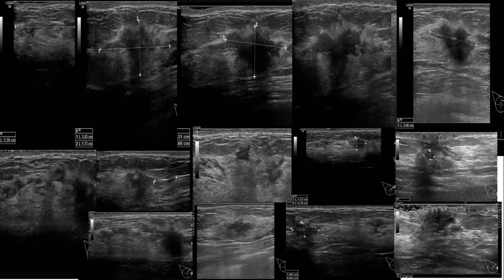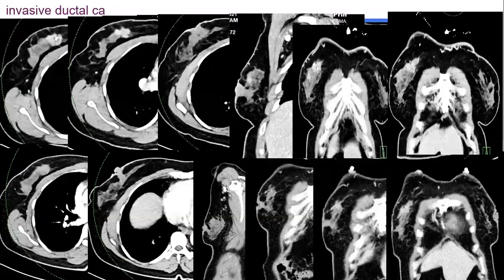So this is a multifocal disease. The whole quadrant is being involved. You see, the upper medial aspect is being involved by multifocal disease. And this is very essential. And the miss is not only on mammography.